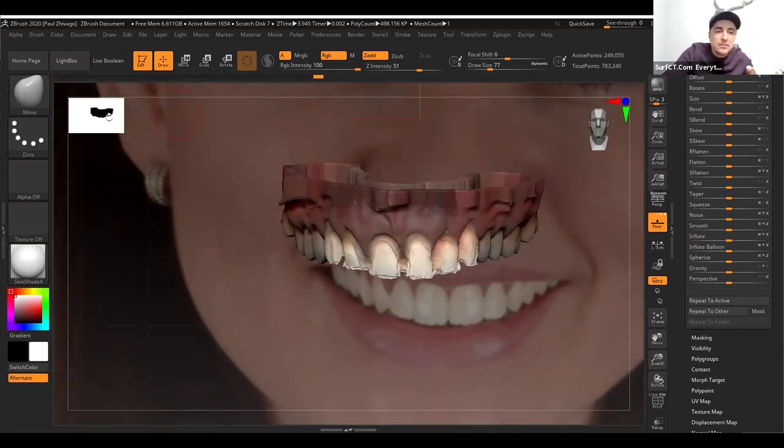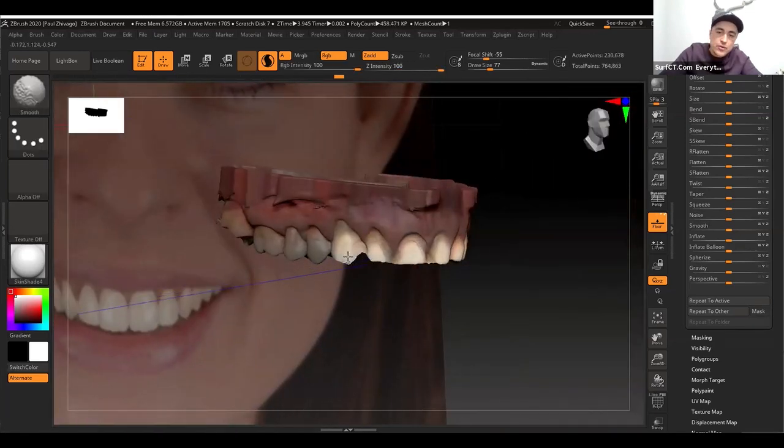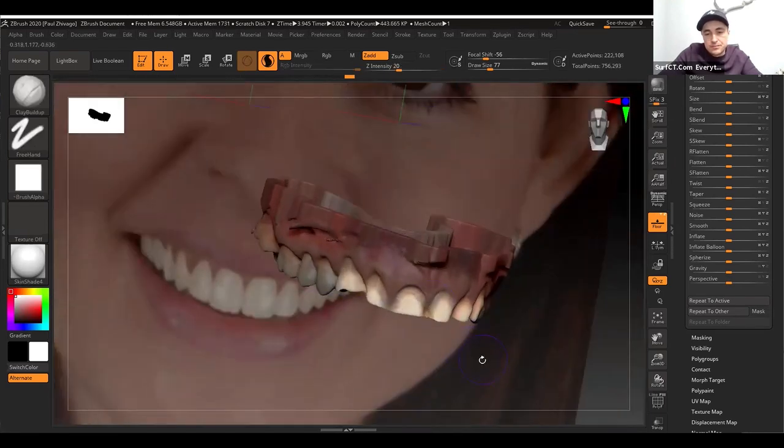You deflate it a little bit, you go to clay brush and then turn the sculptris mode on, shift, and then you smooth these things out. And this is basically a quick virtual prep that will reduce some structure very quickly.